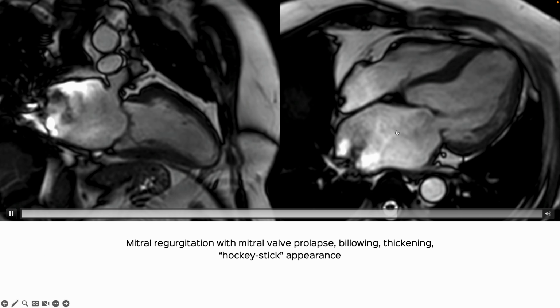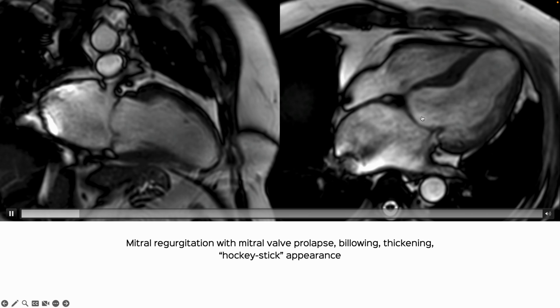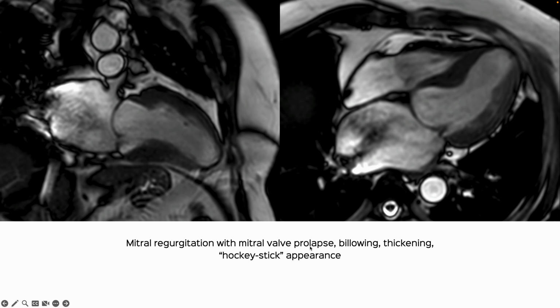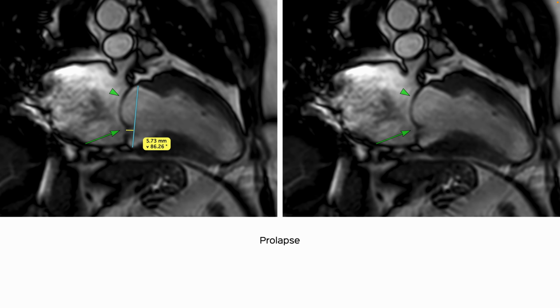If you see that same patient I started with, you can see that the anterior mitral valve leaflet is kind of prolapsing into the left atrium. But is that really prolapse? Now, billowing is when the leaflet is more than 2 millimeters into the left atrium. And this commonly is defined as prolapse too. But if you want to split hairs and be technical about it, then it is when the coaptation point is seen within the left atrium by more than 2 millimeters that we actually use the term prolapse.